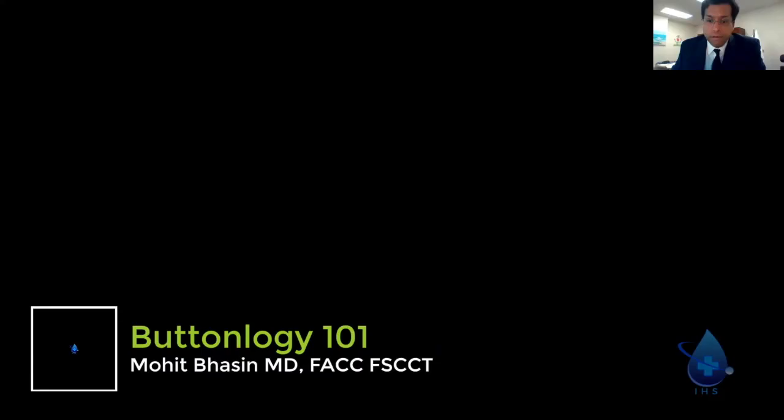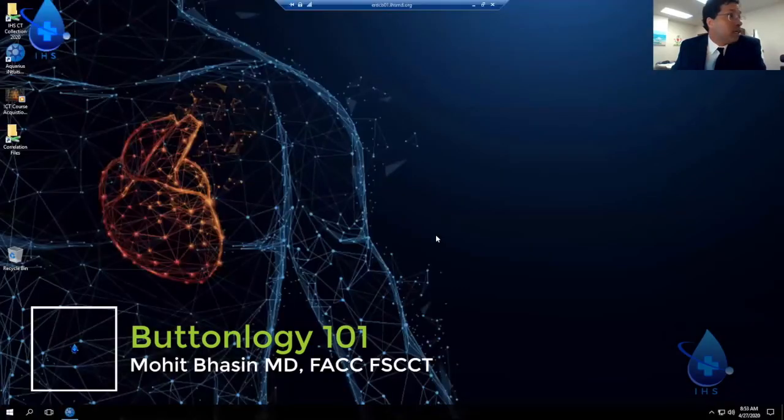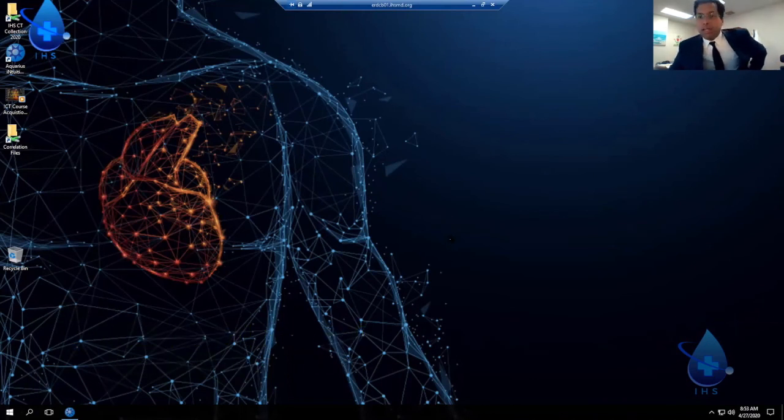Okay, I have remote desktoped into a Terra Recon workstation because of the IHS CT collection, Aquarius, CT course acquisition. When you RDP, or remote desktop protocol, into your workstation, this is what it's going to look like, and they're all the same: Aquarius, Intuition, Terra Recon.